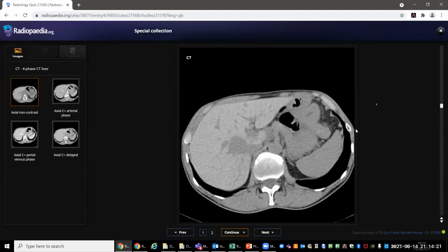And if you're thinking hemochromatosis, what would you want to look for else in the study? Ma'am, then calcification in the pancreas, which I'm not able to see, or I cannot see any altered density in the spleen. Okay. Another part of this patient you want to check on this scan? Pancreas, you've talked about the spleen. And if you see some densities in the pancreas or the spleen, how would that help you? What would that point you towards?